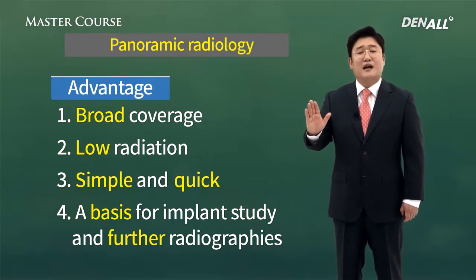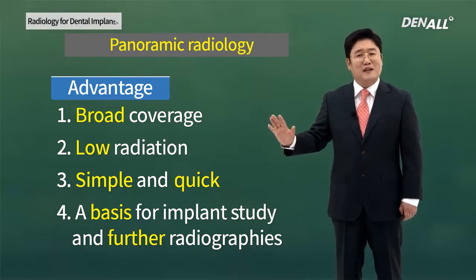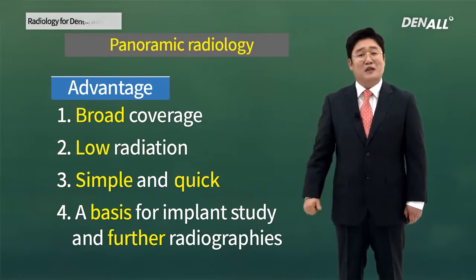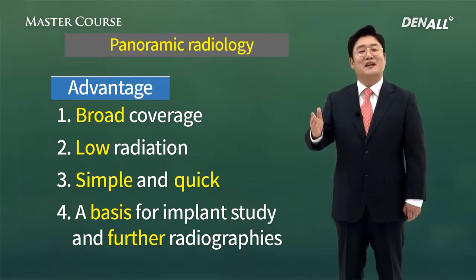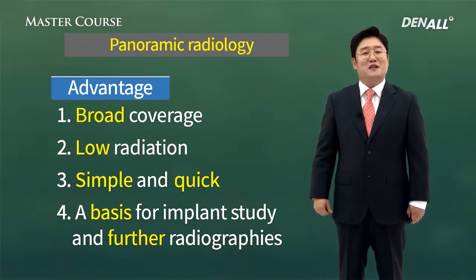Another thing, in Korea, CBCT is very widely and actively used, but in other countries, excluding Korea, panorama is still used quite a lot for implant surgery. That's the advantage of using panorama.